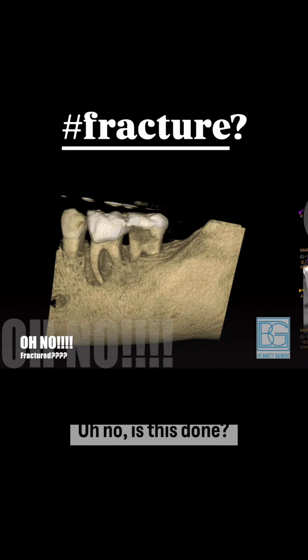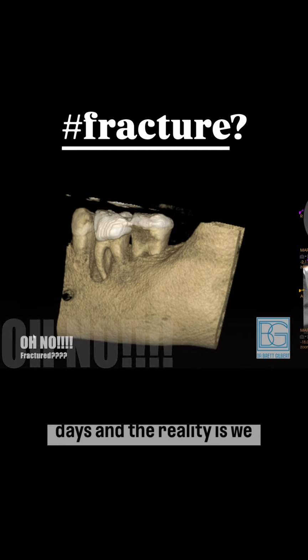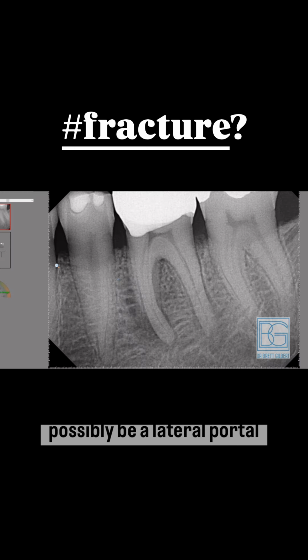Oh no, is this done? Is this a fracture? Is this tooth hopeless? We're confronted with these situations all the time these days. And the reality is we have to look at all possibilities. One is fracture for sure. Secondly, though, could there possibly be a lateral portal of exit that could be causing this type of bone loss?